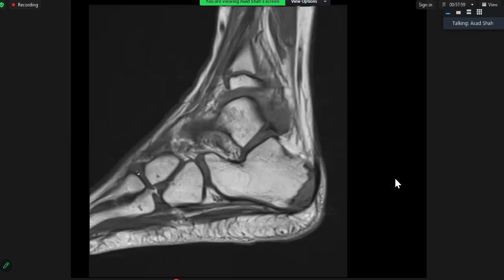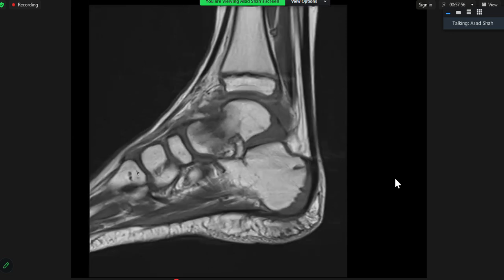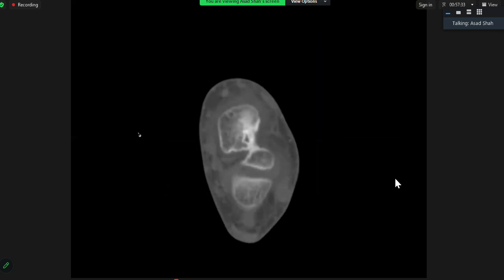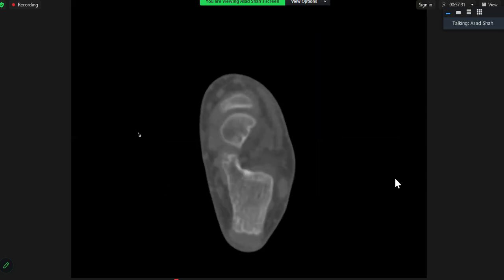So yeah, this is the T1 weighted image now. Any thoughts about that? You saw some sclerosis, so the changes that you saw on X-ray get confirmed here, isn't it? You have got T1 isointense signal, but there is all this edema around it. This area is a bit more dark, more like edema signal on T1. Then, okay, somebody said get a CT. So then you can scroll the CT and give us the diagnosis then.